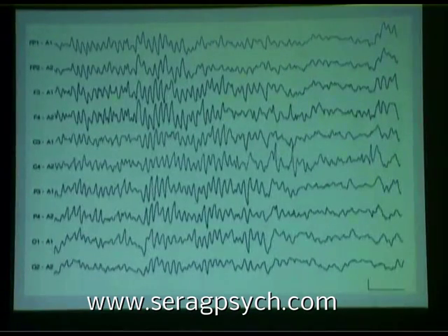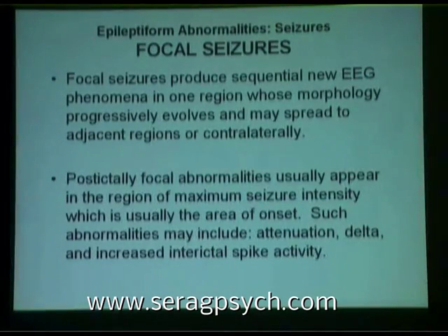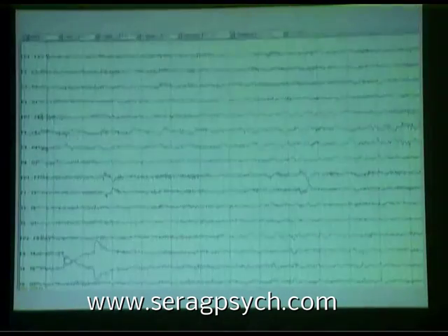And I already told you that during arousal, when you're preoccupied with the diffuse changes, don't miss the little small things in life. Little things mean a lot sometimes, so don't be overwhelmed by the diffuse. Always look for the focal within it. Next, please. Okay, and we've been through that. Let's go ahead, please.